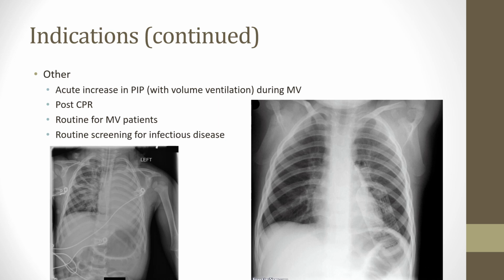Post CPR, of course. Oh heavens, yeah, a lot of things could have happened during CPR. Line placements, especially ET tubes, central lines, you name it. Broken bones could have happened, chest tubes could have happened. So yeah, post CPR definitely for sure.